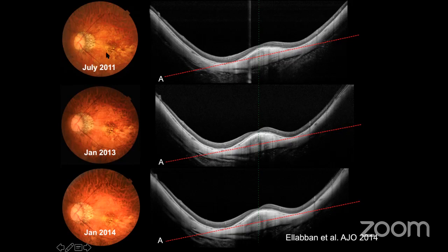So this patient was seen in 2011 and then monitored till 2014. You can see some progression of the atrophic changes along the staphyloma in the posterior pole in this picture compared to the baseline check. And these are 3 vertical OCT scans. They are all centered at the main line, and with careful interpretation of the image, we notice that this is the bulge of the macula.